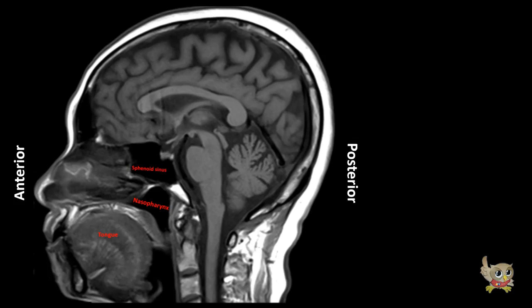Before the skull, we have the subcutaneous fat. The frontal bone is demonstrated in this cut. The clivus is a bony part of the cranium at the skull base. It is the sloping midline surface of the skull base anterior to the foramen magnum and posterior to the dorsum sellae. Now, one of the important landmarks that divides supratentorial from infratentorial structure is the tentorium cerebelli.